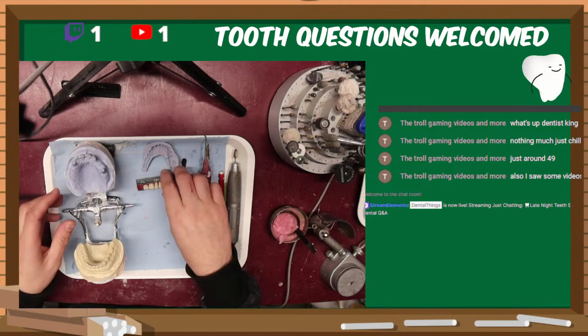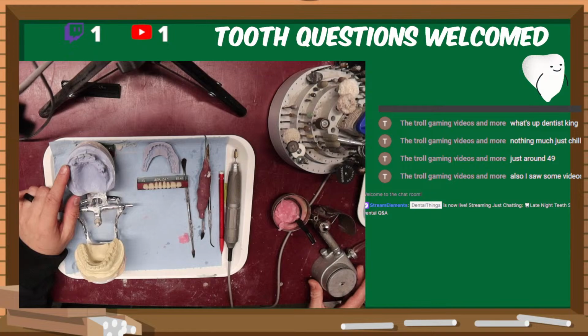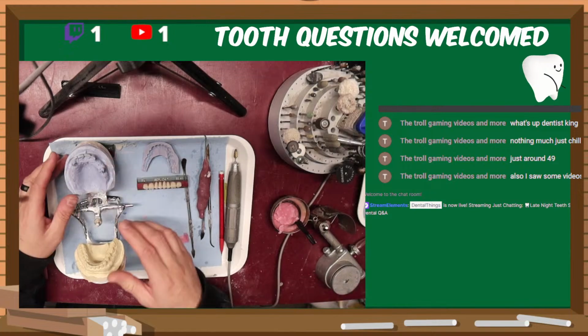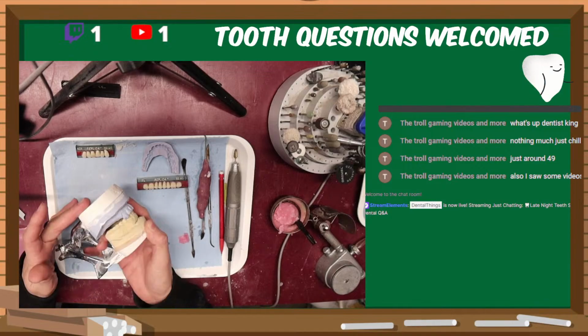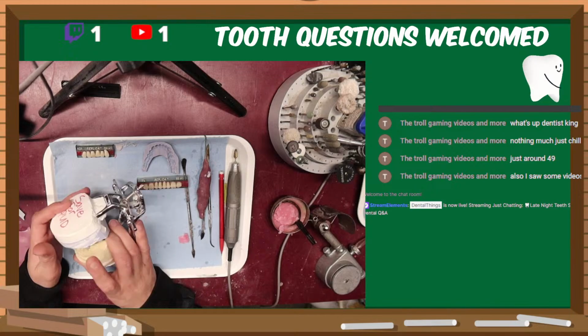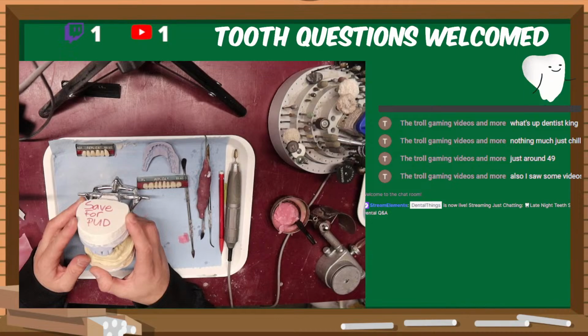Alright, so with that, I have my flame. I can flame on if I need to. And I need to see what my spacing looks like. Because I'm probably not going to make a base plate for this. But I should copy this. I should try to duplicate this.